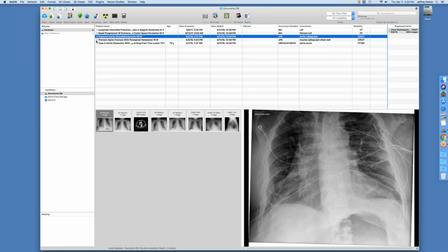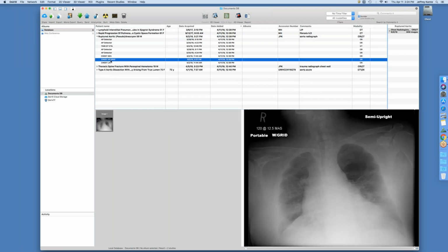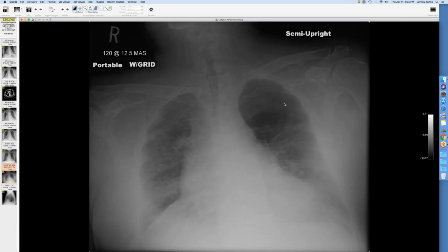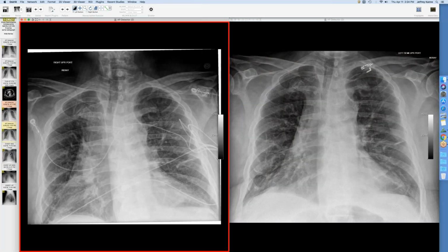Okay, this is a nice case. This was a patient who had, let me see if I can find, so here's an old radiograph. This is a large patient, has a history of some emphysema. This is just to show the normal configuration of the heart and mediastinum. The patient had some kind of underlying infection, was admitted, was getting ready to go home from the hospital, and had been transferred here. So here's an earlier image, and you can see some atelectasis in the base, maybe some volume loss on that right side. And then I'm going to put up a series of chest radiographs.